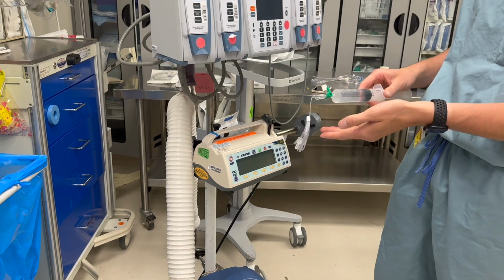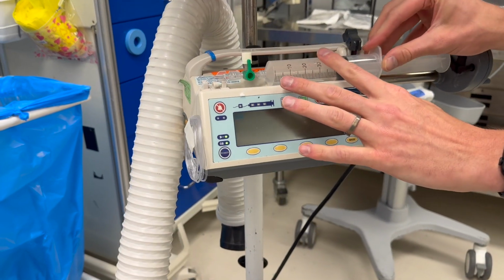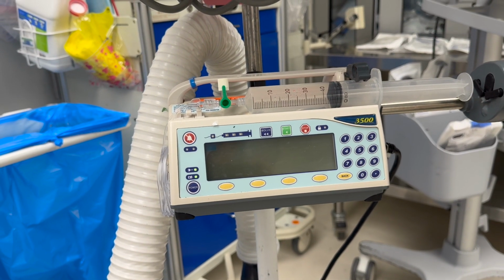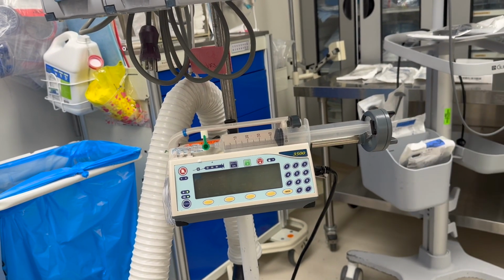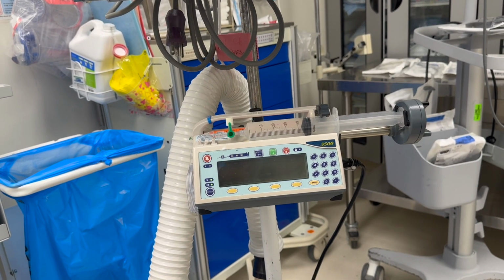So you have your tubing here. We've already flushed the tubing through as well. This wing of the syringe connects in right there. It locks into place. This clamp slides around and it holds onto the syringe. And then we click right here, we open this up and we attach it to the back plunger of our syringe. This is now hooked up and ready to go. We will turn this on. It will take 1 second to turn on.